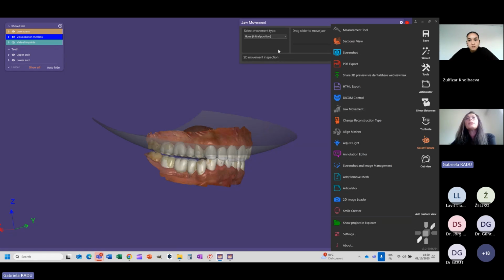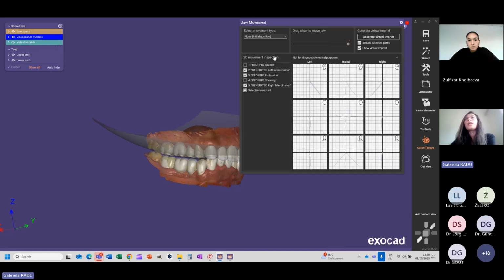And when we activate Jaw Motion, we will have the list of motions that we have from Sphere. Those single lines, trajectories that are usable for a design, because we can't use the whole motion. We need to prepare them first. And Sphere will help us, or the lab part in this area, because we'll have only those trajectories that we can use for our design.